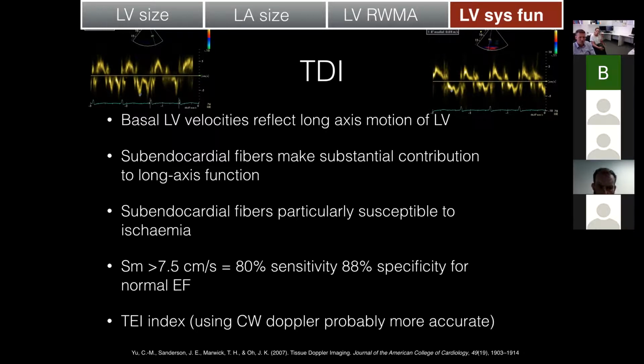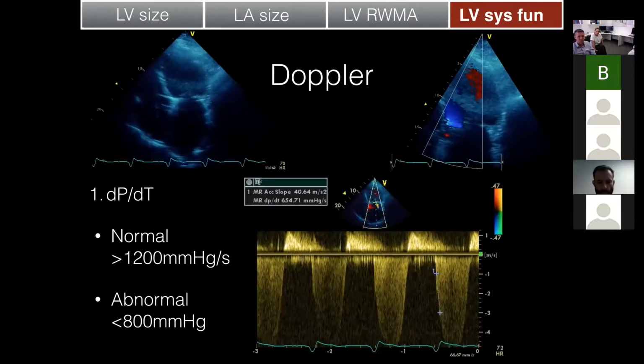So I don't know how well this comes up, but that's the movement during systole. So systole, beginning the QRS, the end of the T wave, it's that movement up. And again, we'll talk about that a little bit later maybe.